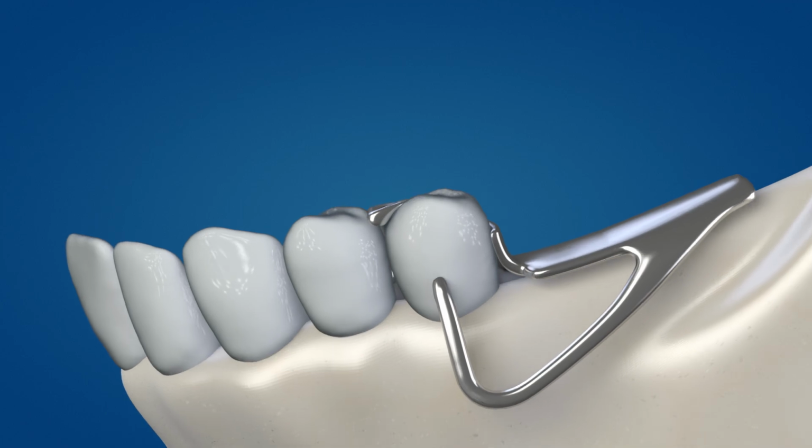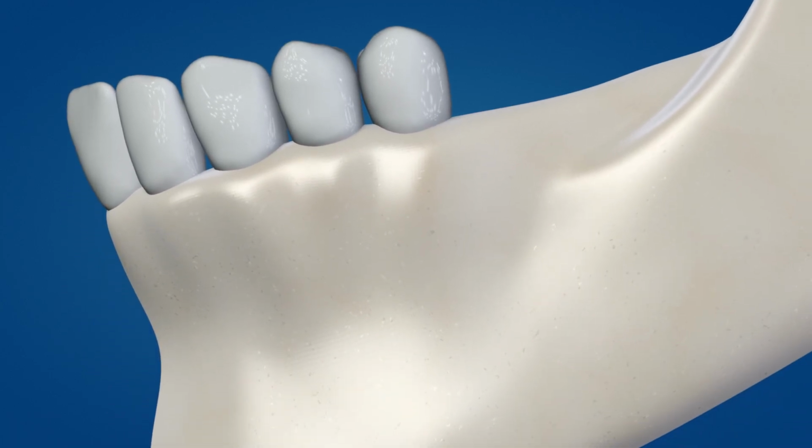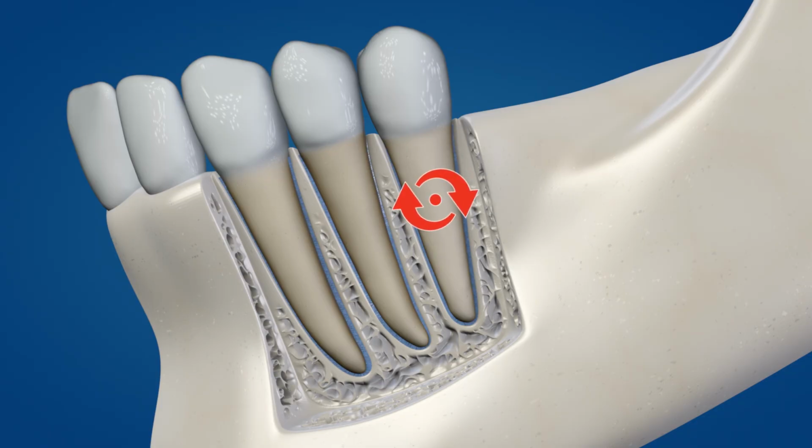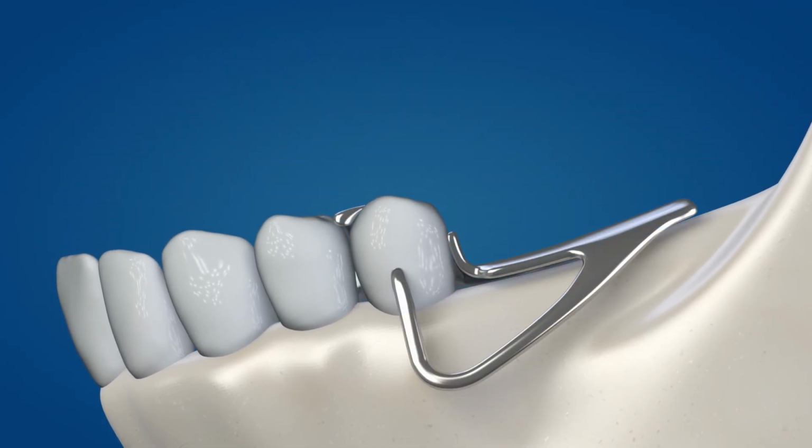This would compromise the passivity of the clasp assembly and could result in unwanted and uncontrolled forces. This too would be potentially damaging to the abutment and would compromise the RPD's service. So proper design is absolutely essential.